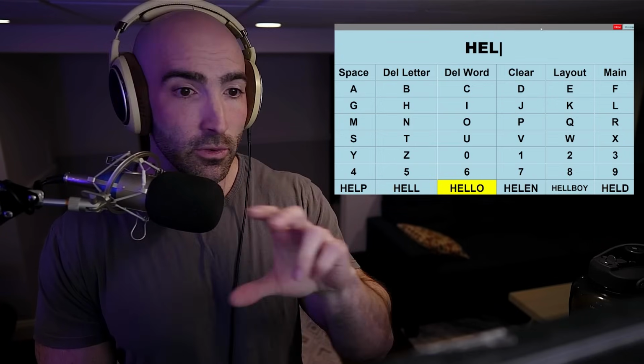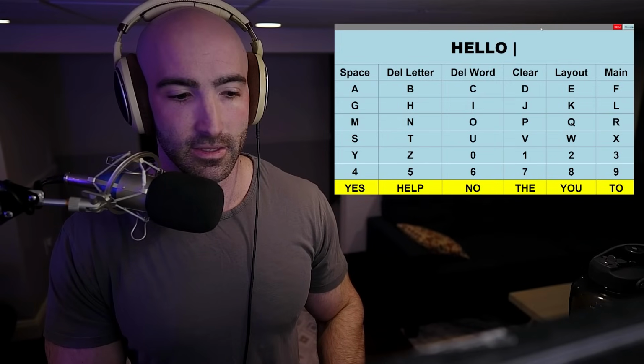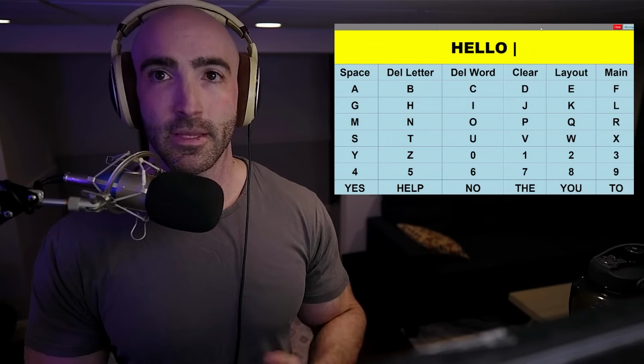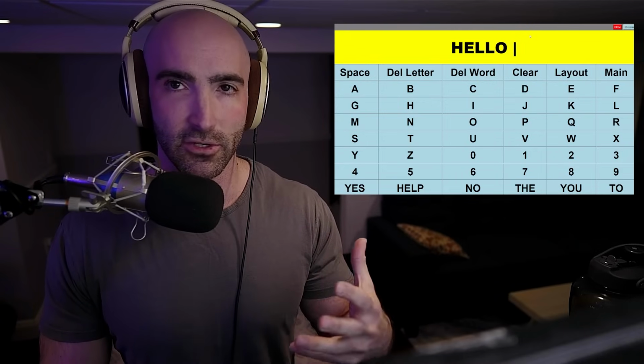It will remove what he was typing before and put that word. So now hello's in there. He just has to click spacebar once or his left button once, and he can say hello. Hello. So yeah, he can do this, and it has a very robust predictive text feature that I added.